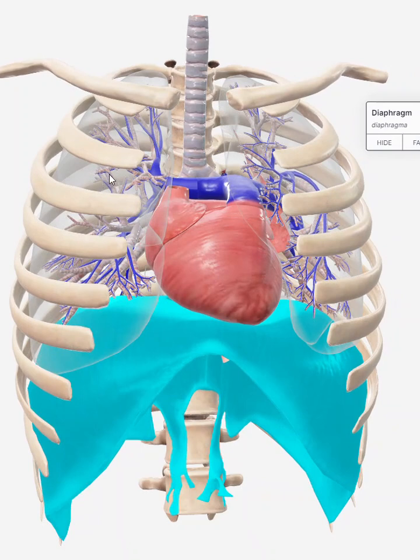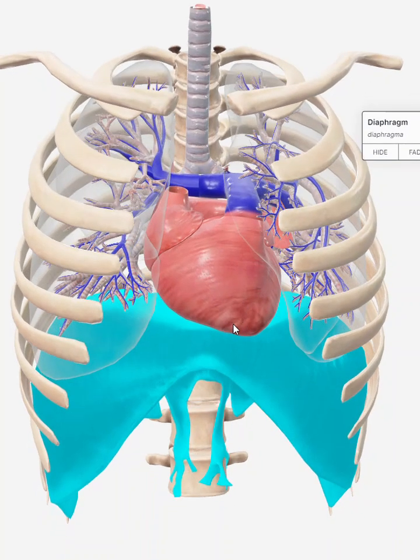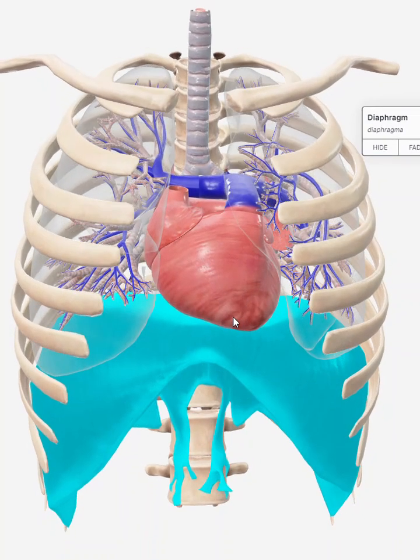These little tiny vessels on our x-ray are what we call lung markings. So these little vessels that we see out in the lungs, even like the vascular, when I took it away, there's all these little vessels in the lungs. If those little tiny vessels are burned out or too dark, that means that we used too much mAs in our technique. So that's another thing to think about with your controlling factors for that.